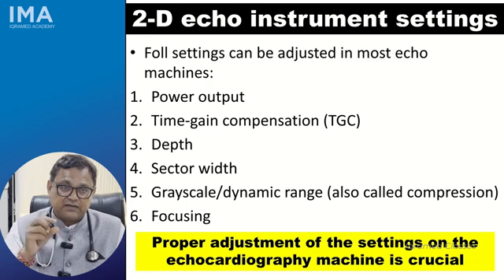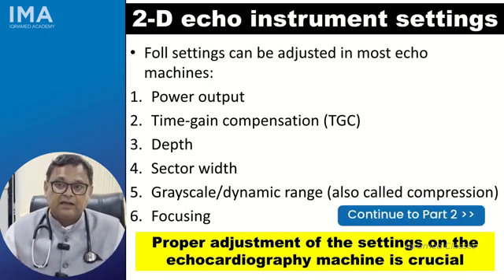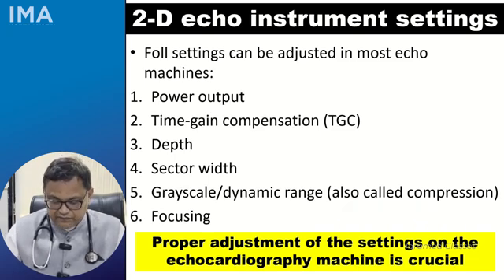And then of course there are settings for focusing. So these are the settings that you need to know in any echo machine, and I will show you how to take care of them one by one.